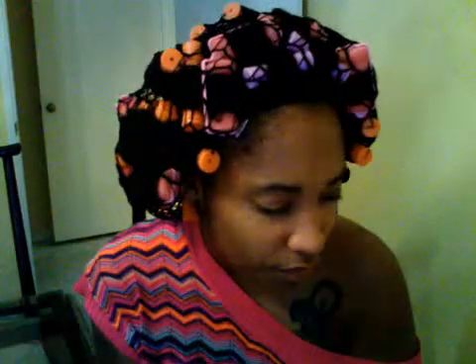it's gonna squeeze their little heart and it's gonna beat a little faster. And then when they breathe out, then there's gonna be more room. It's gonna be looser in there, and the heart's gonna be beating slower. So that's something that you might wanna be mindful of. That's nothing that needs to be treated, but like I said, in the EKG, it won't walk out. It's not like some horrible rate that you need to go, oh my God, give him a shot. It's not the case.